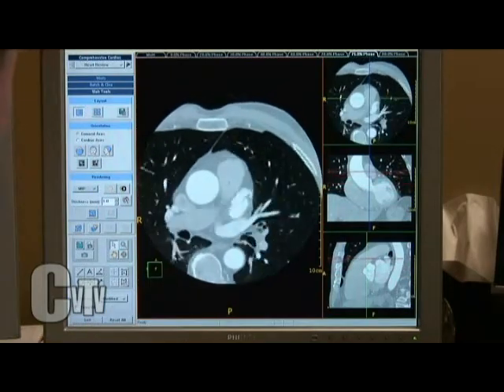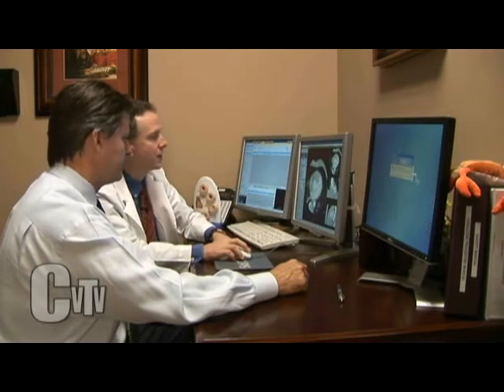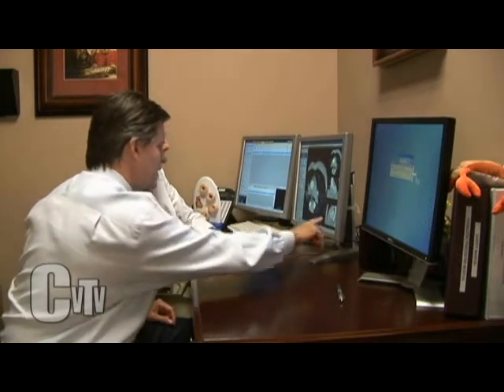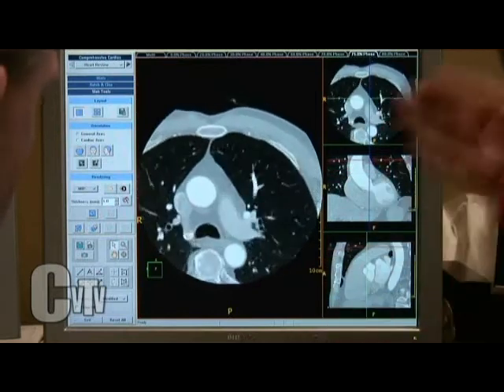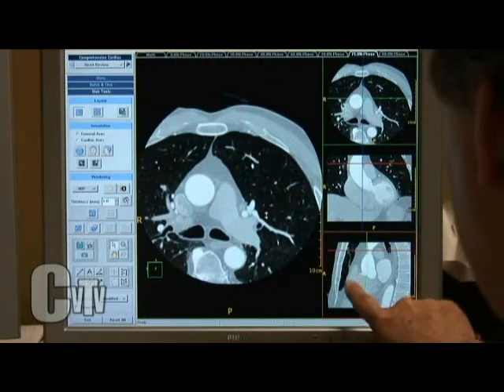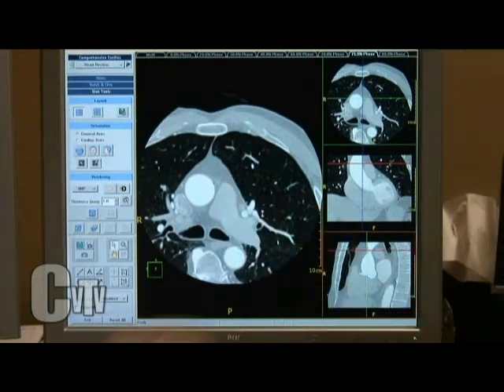No cancers, tumors, masses. We can detect emphysema here, even the earliest amounts of emphysema, pneumonias, fluid on the lungs. So we're looking for all that in the lung windows, as we call it. And you didn't talk about this box right here, but I'm actually seeing, as you're doing here, this is looking at the person from the side. We're slicing you right down the middle. Okay. And what we're seeing here is the same data set.